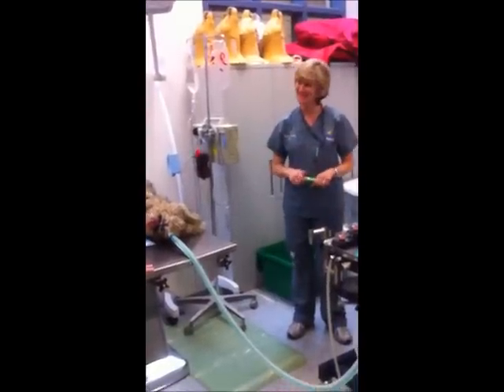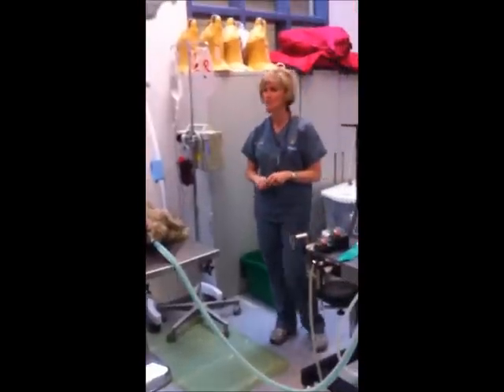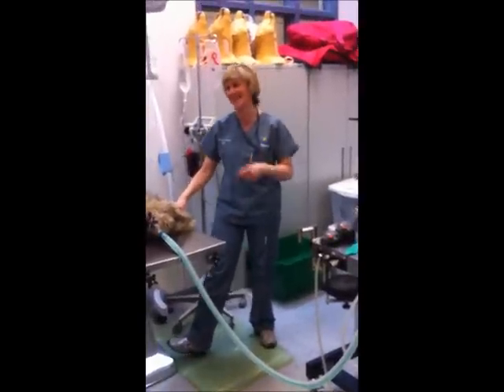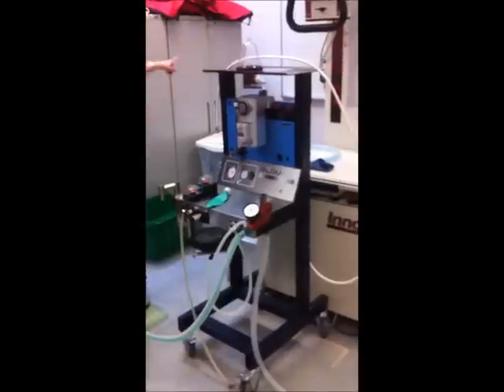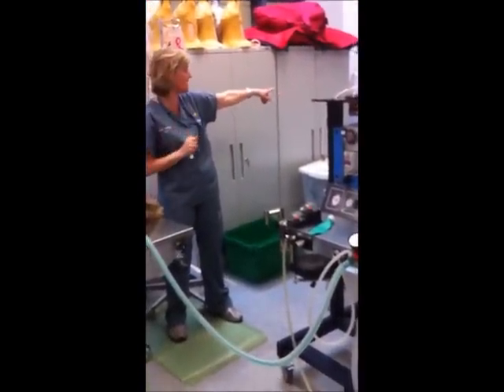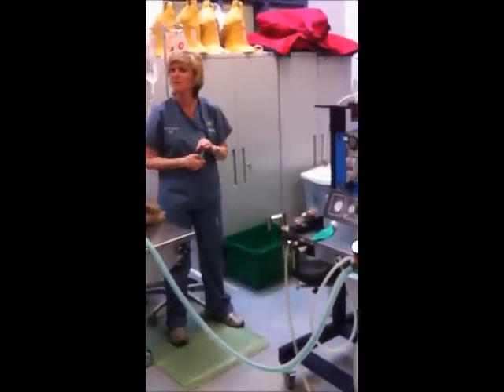And you're not going to put on the test just specifically 8 kilograms, right? I won't do that. No, but the joke, as I said, is if something happens to me and Carol comes through the testing, I can't promise you. But no, I don't ever ask. But you're ready for that, right? Because if it's 8 kilograms or more, rebreathing; 7.9999, not. It kind of makes sense, rebreathing for a bigger dog. That's how I think of it.